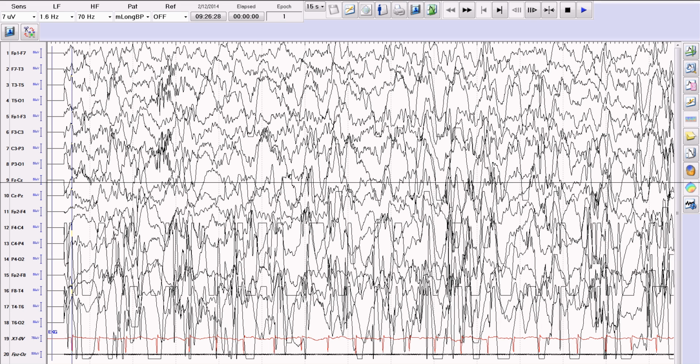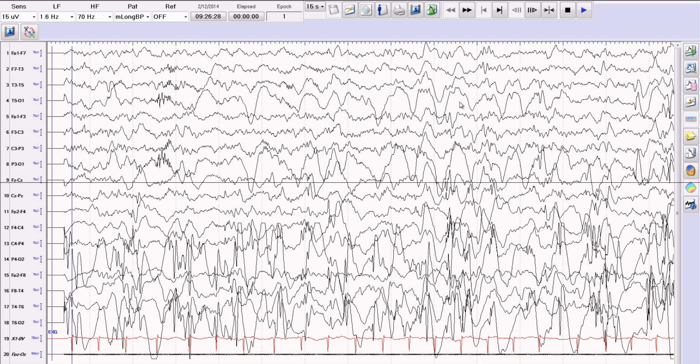Here is our next EEG example. This is another pre-treatment patient presenting with infantile spasms with a high burden of epileptiform discharges. There also happen to be common high-amplitude posterior slow waves. If I adjust the sensitivity, you can see that the spikes are predominantly in the right hemisphere, but are truly multifocal.